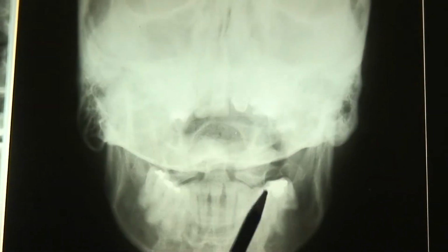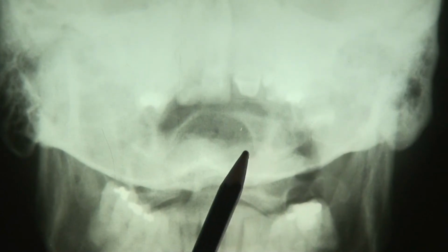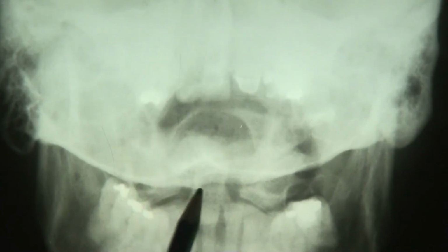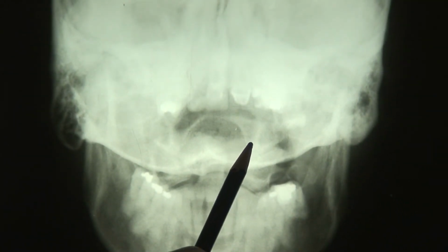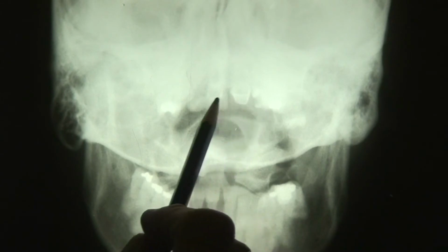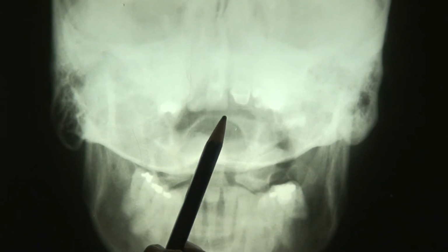What happened in this case, somebody put the cork in the mouth, or if they didn't have a cork, they opened the mouth, and instead of having the patient in the normal natural position with their chin tucked slightly, they allowed the head to be in a little bit of extension. When it was in extension right here, it moved the position of the foramen magnum.